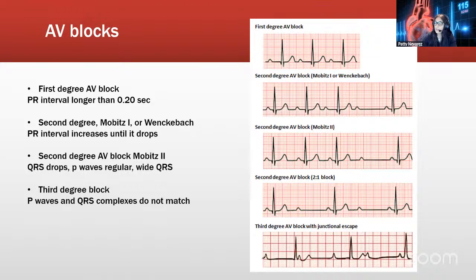And then is there a P wave before each QRS? So we're going to look at this here. There's a P, but then there's no QRS. And then here, it's kind of tricky because the P wave is this one, but then there's no QRS. And then this one is a P wave, and then there's a QRS, and then here. So it is all over the place.